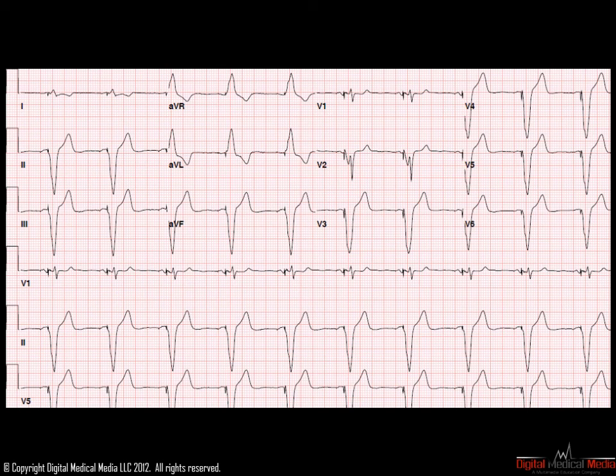A single lead pacemaker generally paces only the ventricle. A dual chamber pacemaker paces both the atrium and the ventricle. The typical manifestation of an electronically paced rhythm is that an electronic pacing spike is present right before the depolarization of the chamber in question.